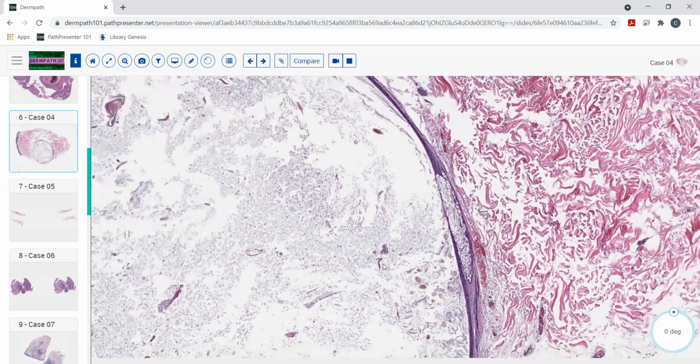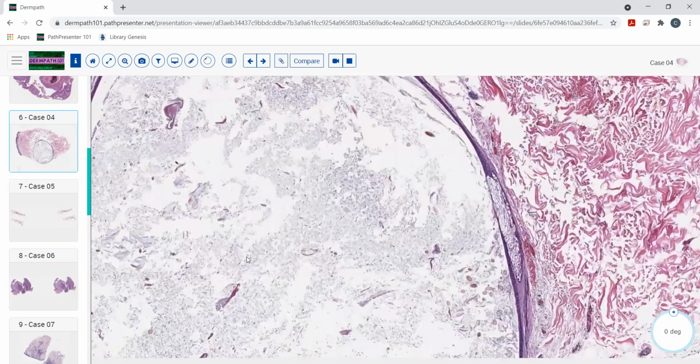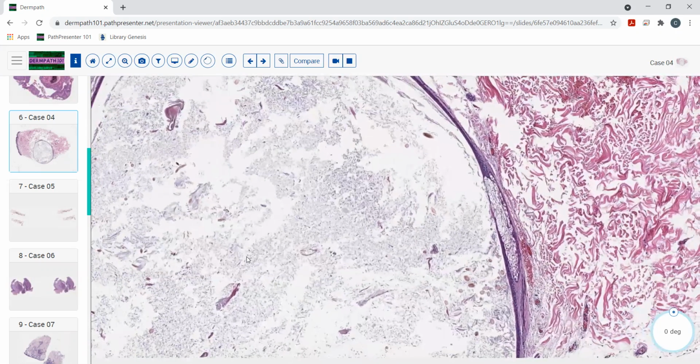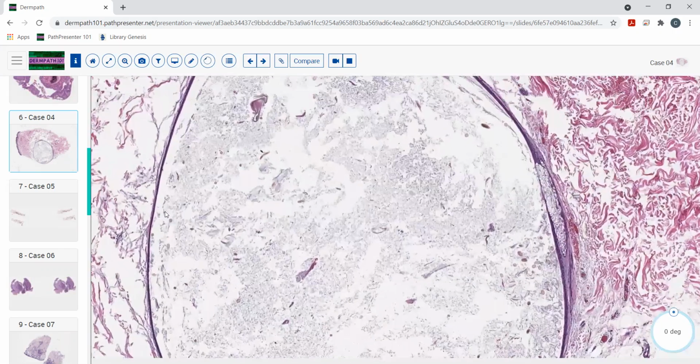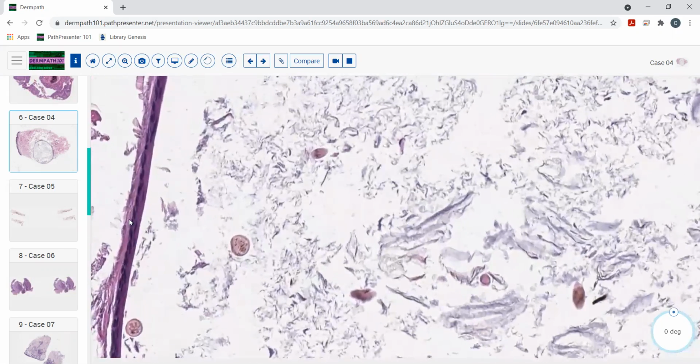So, and it's got all of these vellus hair follicles, which we see like in patients, for example, that may have trichostasis spinulosa. They get 4 or 5 little vellus hair follicles inside a dilated follicular ostium. So this is probably analogous to that, but it's just formed an actual cyst that's lined by this very thin epithelium. And the epithelium is thin because of the type of cyst that this is. This is not compressed. It's not like smushed and made smaller. It's really only about a 2 to 3 cell layer thick wall. And that's kind of analogous to what we'll see when we look at the steatocystoma in a minute.